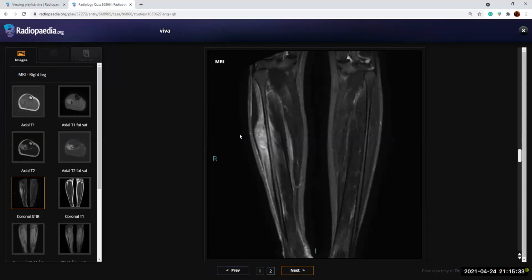When we are saying osteomyelitis and we are taking a sample from this, if it's a sarcoma, you're not going to be touching this lesion. Those kind of small things we need to keep in mind, because it is something you have already asked for and I've already provided you with that history. Those points should be there in our head because that is what they're leading us on to. Otherwise you've got this also right.